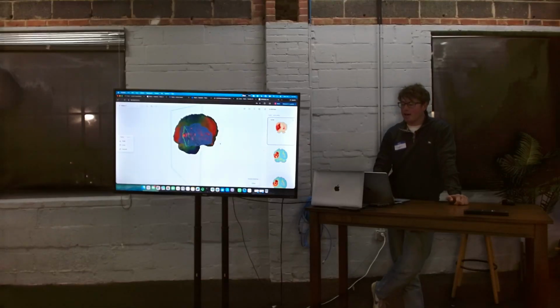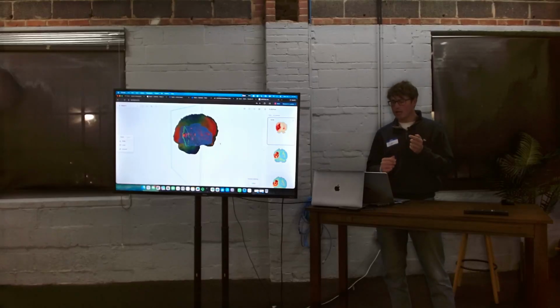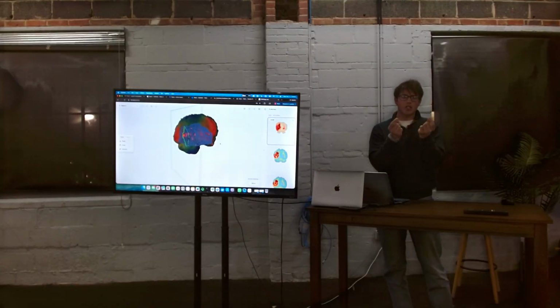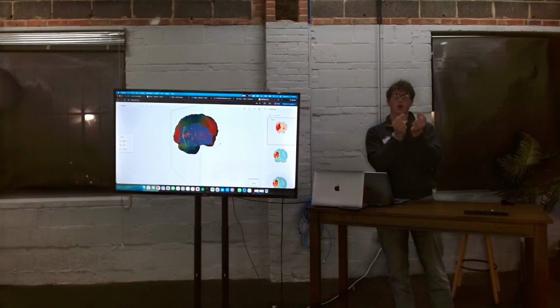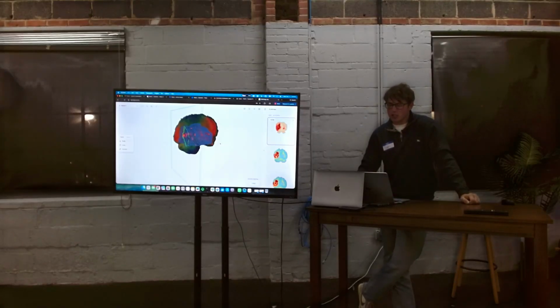Now that I have these segmentations at every single plane across this, what I did is I actually hooked up what Ron was describing, Gaussian splatting. And so now that I have all of these segmentations, I actually want to try to create a mesh around it. And sometimes you'll have planes that are very sparse. They're very far apart. And what you actually want to do is fill in the gaps. And so what I used is the gsplat library.